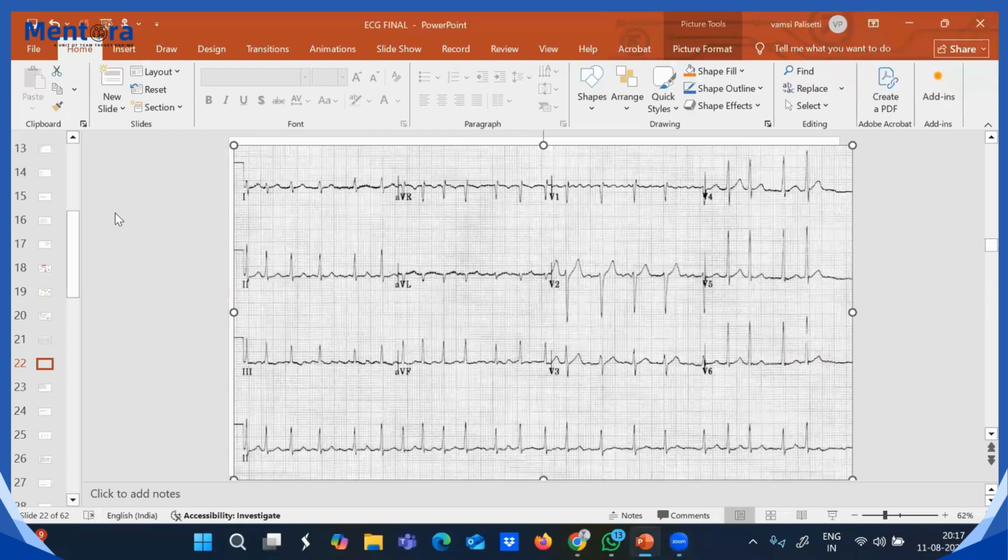Narrow complex, irregular. It's a narrow complex, right? You can identify it's irregular, right? Here, irregular rhythm is like that. Between two R waves there are always just one or two large boxes in a regular rhythm, but here between two there are always some more boxes. So that indicates your irregular rhythm, right?